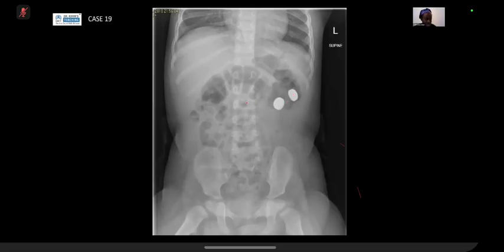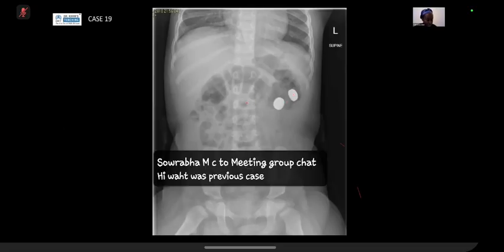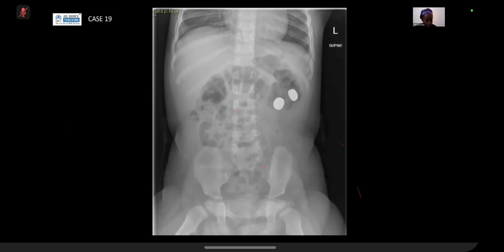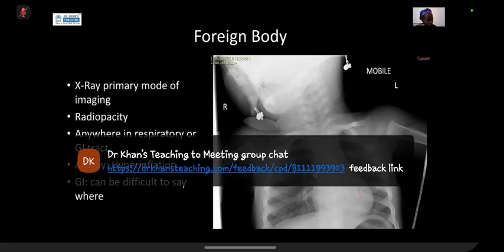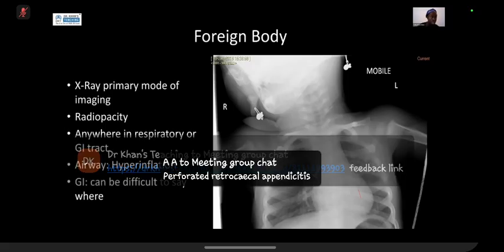Important negatives, like you said, are to look for any features of pneumoperitoneum to suggest perforation, and then I also look for any bowel obstruction as well. But this is a non-specific bowel gas pattern. So things that children can ingest include button batteries. They can ingest magnets, and in the UK we've actually recently changed, in the last year, our imaging protocol for magnets.